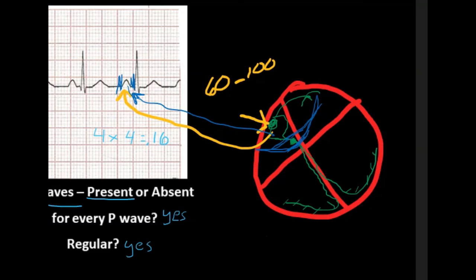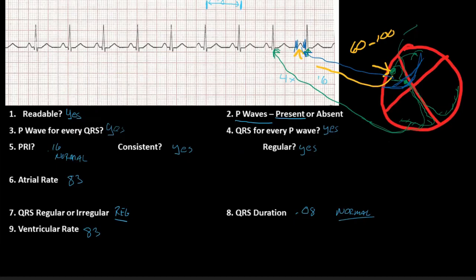Then our ventricles are going to be, let me get green here. Okay, so our ventricles are going to be represented here by the QRS. Okay, let's make that a little bit easier for you to see, right? So we're going to say that our QRS here, right? So if we take this, it's represented right here. Okay, so the Purkinjes are being represented right here for the QRS complex. And these are firing together. So this impulse sends off, it travels all the way down through, and it fires everything else that it's supposed to. Okay? Hopefully, gives you the idea that this is normal.